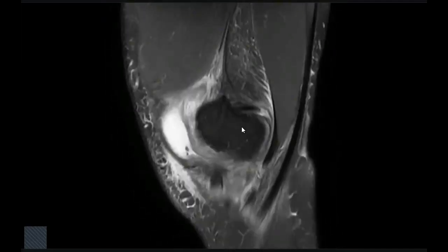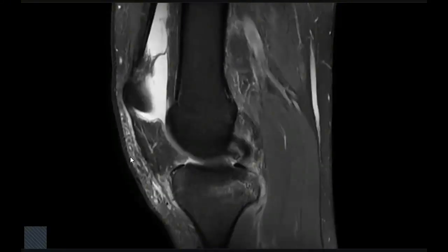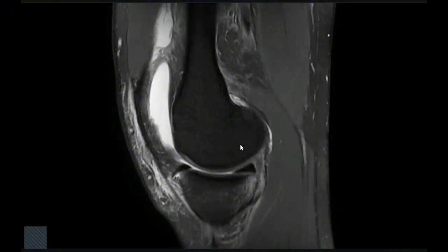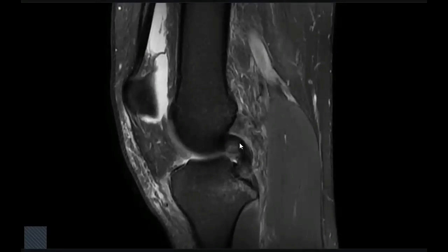Conclusion? I also check the posterior muscles and whether there is any Baker cyst. There is also prepatellar soft tissue edema. So this is a case of ACL tear with suprapatellar joint effusion. No acute bone injury. This is an anterior cruciate ligament injury. How will you manage this case?